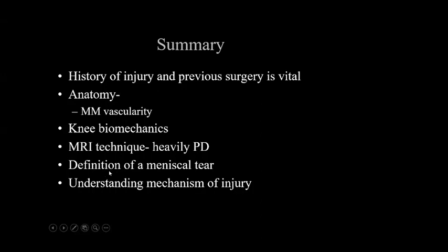And we emphasized the definition of meniscal tears, and we said there are two criteria for describing meniscal tears. Criteria number one, when there is a fluid-filled cleft in the meniscus breaching the articular surface, seen on two slices and two planes. So if that is what you see in the meniscus, then the accuracy of the MRI should be more than 95%, i.e., if the orthopedic surgeons were to do a knee arthroscopy, in 95% of the cases, they will find a meniscal tear.